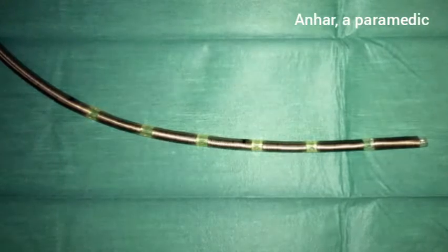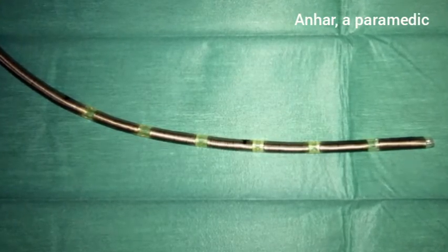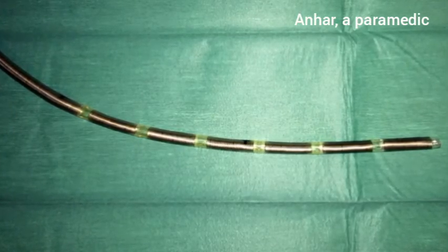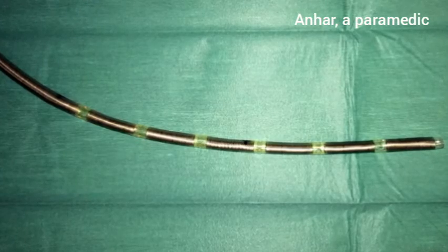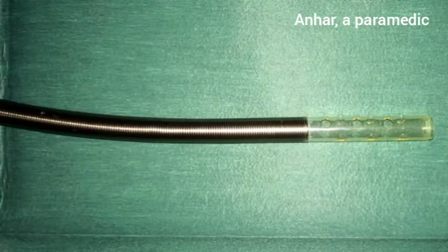This is an access cannula. It is multi-stage in nature, which means it has holes along the distal third of its length, and it is inserted into the femoral vein and advanced under fluoroscopy or ultrasound until the tip sits within the intrahepatic vena cava. This is a return cannula, which is inserted into the femoral vein and is advanced to the junction of the inferior vena cava and the right atrium.